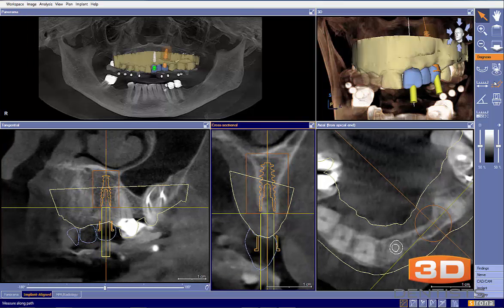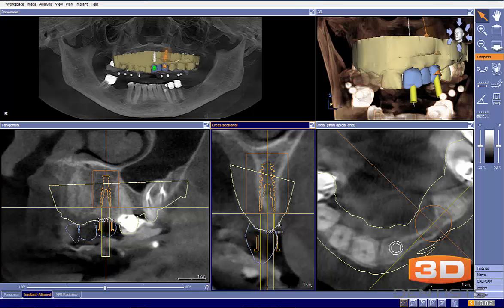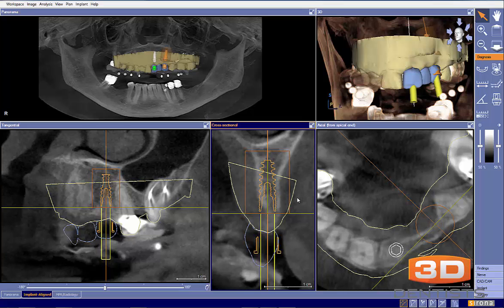Okay. So now we move our focus to the canine, and from there, my first thought on this canine is, how deep are we? And again, assuming that our margin is drawn correctly, right now our implant head is about 5 millimeters below the proposed gingival margin, which we know that ideally we want that to be 3.5 millimeters. So our implant should probably be in a vertical position about yay high or so. So that gives us a better idea there.